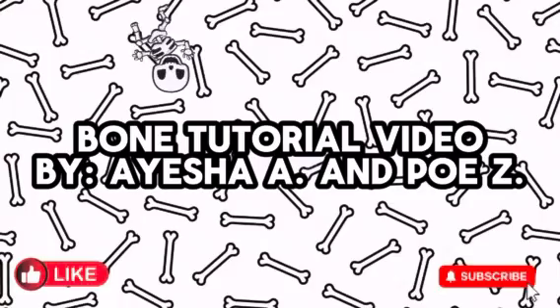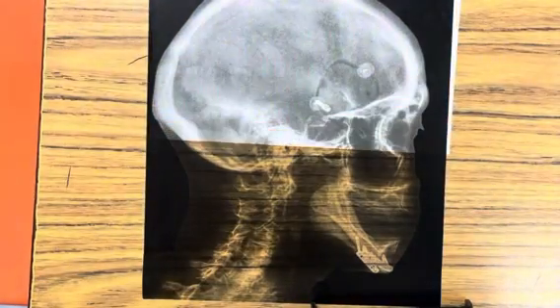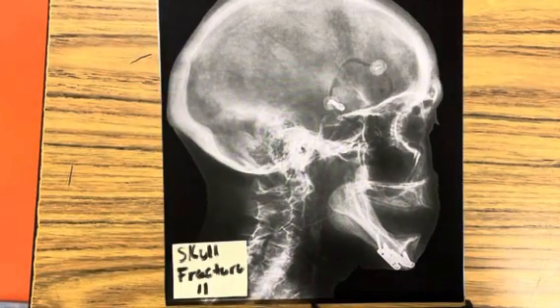Ho ho ho! Our first x-ray is the skull fracture. This results from a blow to the head. They can sometimes be associated with an underlying brain injury that may require immediate surgical treatment.